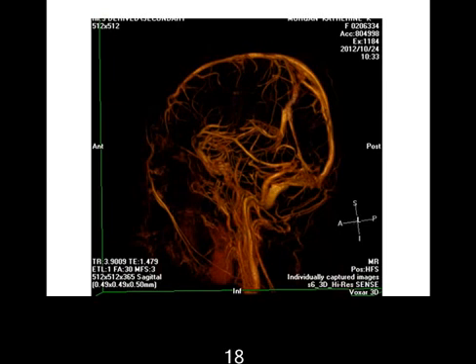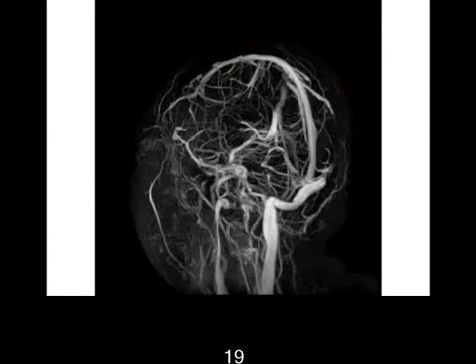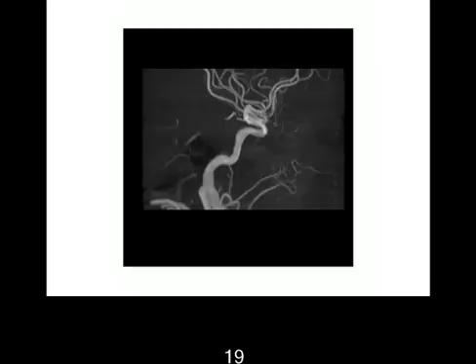So this is the dural venous sinus, the superior sagittal sinus, the internal cerebral vein, the straight sinus, vein of Galen, sigmoid sinus. I'll show you more. This is what we usually deal with, the black and white picture, and then we can rotate it to find out which vein is occluded, which vein is patent. It's a good anatomy study.